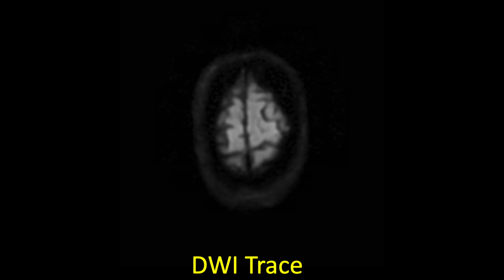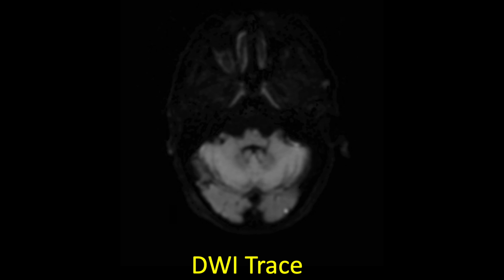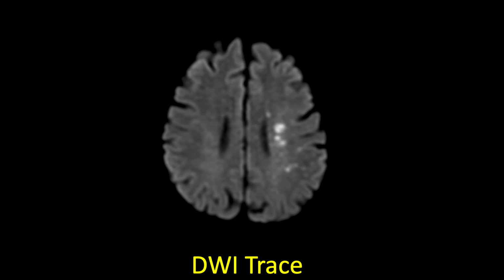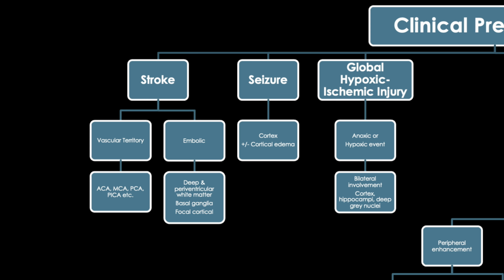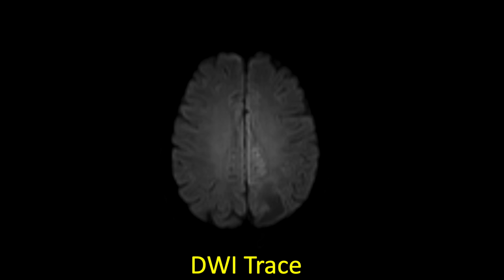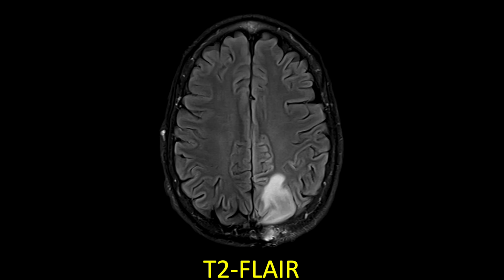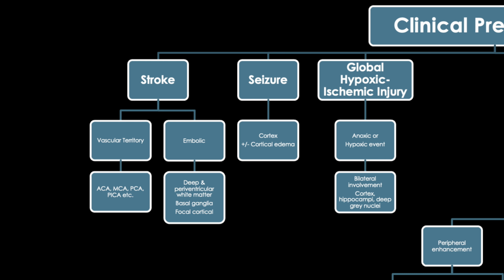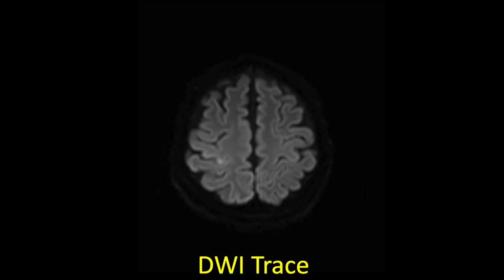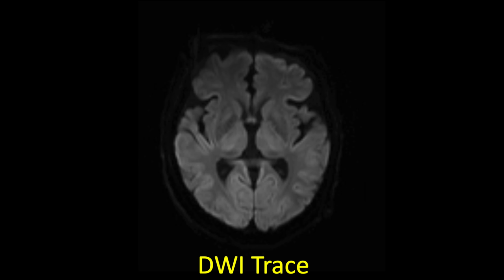If it's a stroke, you're looking for either a vascular territory pattern of restricted diffusion or scattered embolic pattern. If it's a seizure, you're looking for abnormal restricted diffusion within the cortex and any associated cortical edema. And if it's concerning for a global hypoxic ischemic injury, you're inspecting those high metabolic areas of the cortex such as the perirolandic region, occipital lobes, hippocampi, along with the deep gray nuclei.